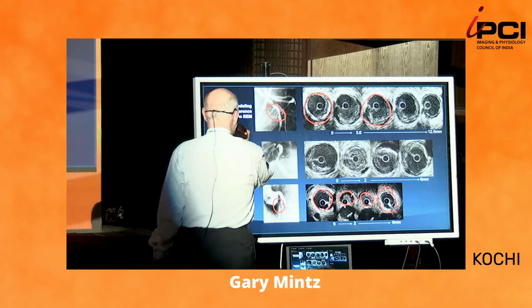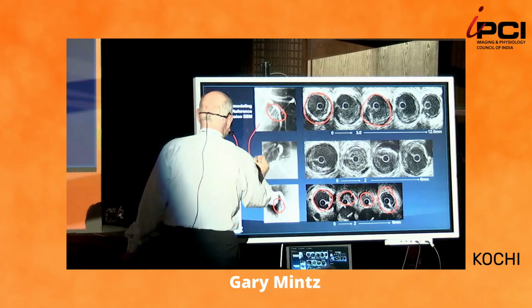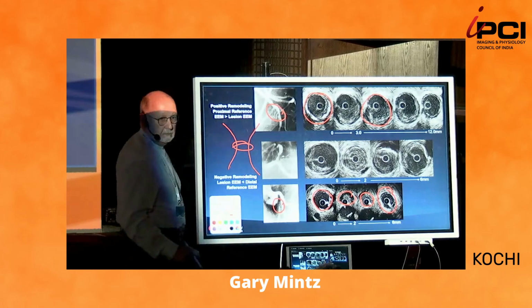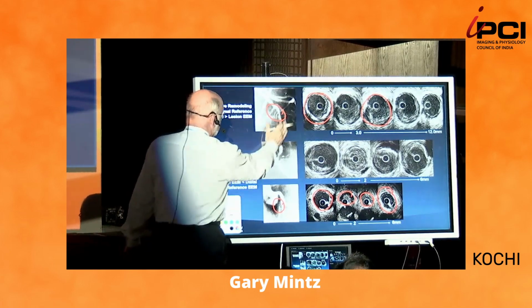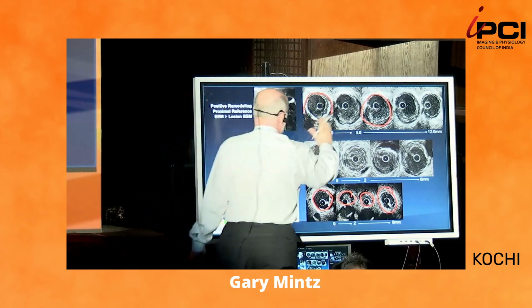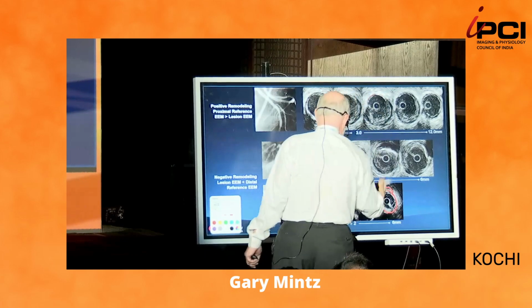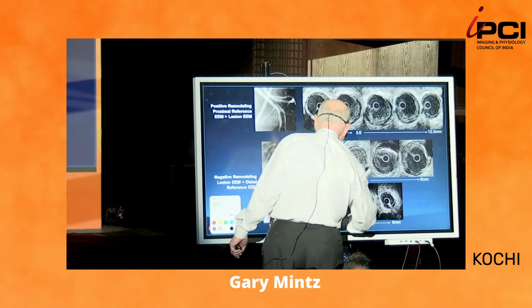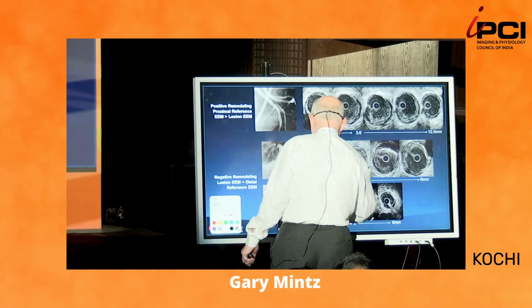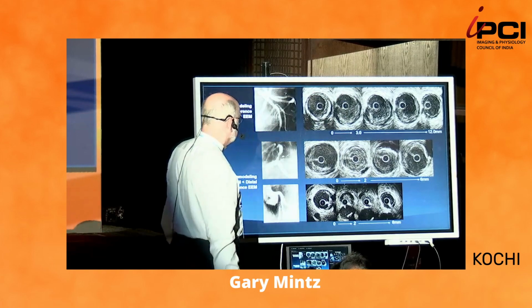The vessel has an hourglass shape, with modest amounts of plaque here. Almost all ostial lesions have negative remodeling. Other lesions do as well, and we're not really quite sure why, but negative remodeled lesions tend to have more calcium than non-negatively remodeled lesions.